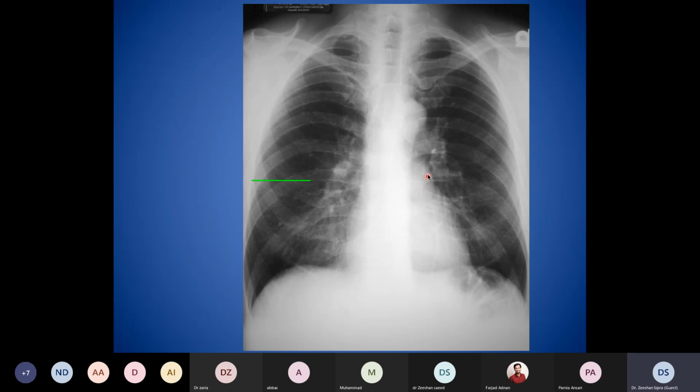On the left heart border, I hope you remember this was the aortic knuckle above, and this is another knuckle over here. This is part of the pulmonary trunk. Sorry, the venous channels are over here, coming to the left heart. These are the pulmonary arteries and veins. The pulmonary trunk is the arterial system. The pulmonary arterial trunk is the outflow tract of the right ventricle.